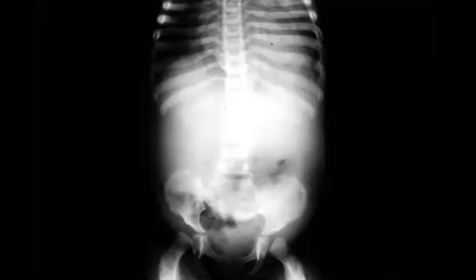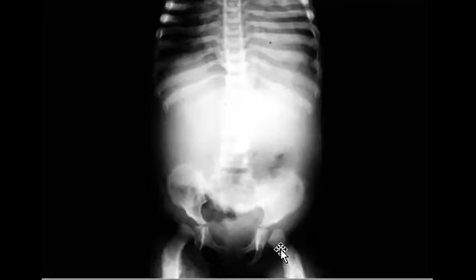And what about the acetabulum? What happened here to the acetabular angles? Is it increased or decreased? And also you can see the femoral heads. So flared acetabula, and what happened with the acetabular angles? They are increased. Yeah, the acetabular angle increased, and the femoral heads are dysplastic.